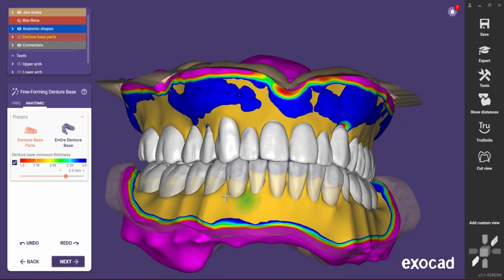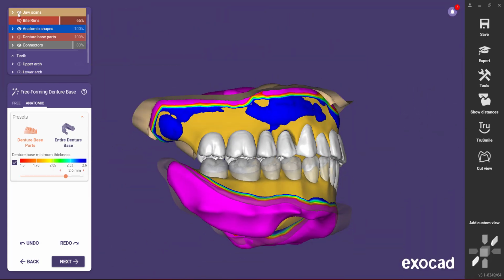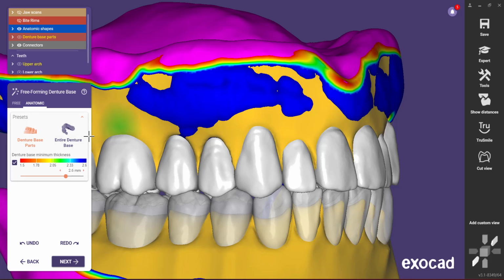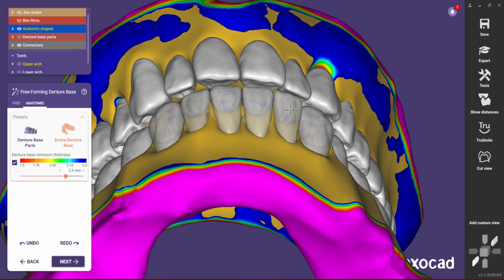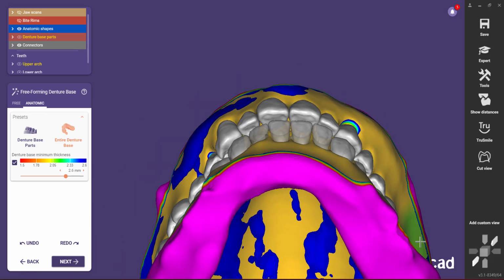All right. And so here is your opportunity to festoon. At this point, you're going to notice the inside is irrelevant. Don't even worry about that. You're just looking at your exterior here. This is the tool where you can just drag it out, and that makes big changes very quickly.